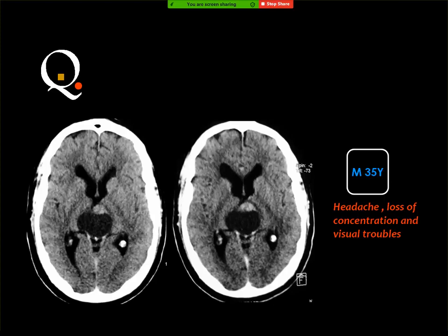Doctor, if it is opened anteriorly, it is cavum septum pellucidum? Yes, it is continuous between the frontal horns of the ventricles. We consider it cavum septum pellucidum and vergae. Oh, it is different here. Yeah. Okay. Is it a cyst? Colloid cyst? No.